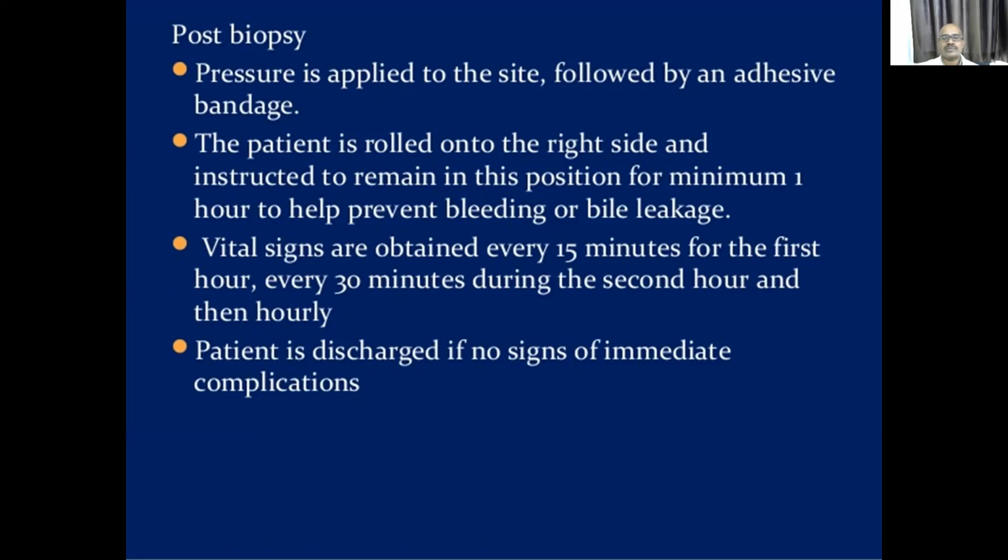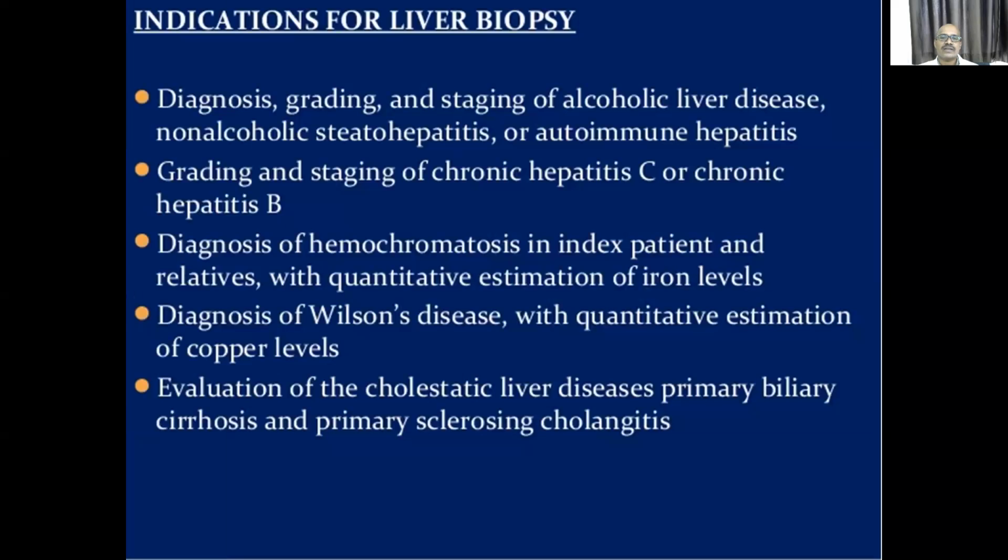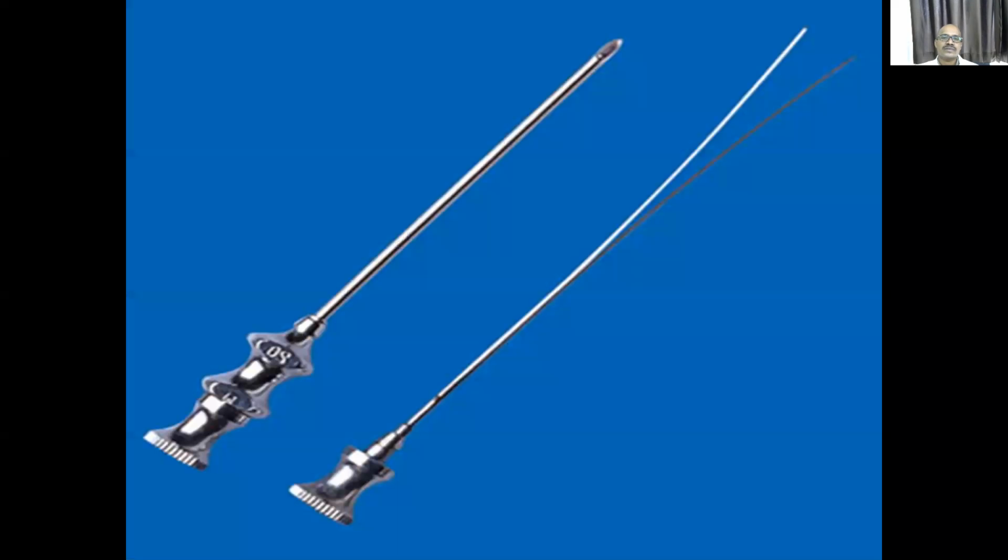So that is about the liver biopsy procedure. Regarding the liver biopsy needle, if the examiner gives you this needle with a bifid tongue, then it is a Silverman liver biopsy needle.